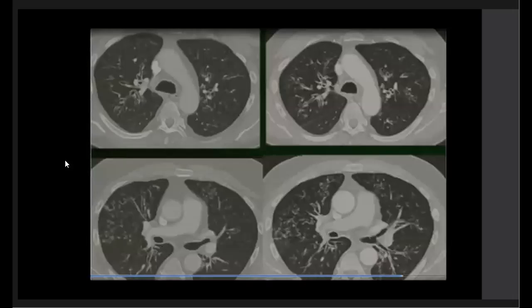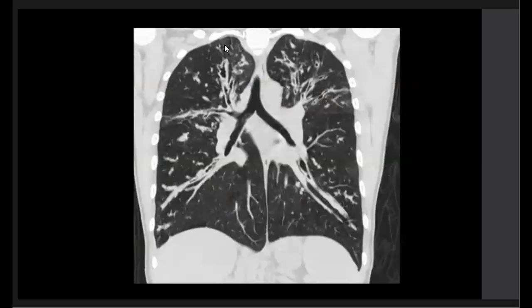Here, a patient with bronchiectasis, and we see a tree-in-bud appearance, as we see here, with some ground glass appearance, and we see some bronchial wall thickening with tram-like appearance, and some signet ring appearance in some areas here. Here, tree-in-bud appearance. Here, tree-in-bud appearance with some ground glass appearance. Here, another patient with bronchiectasis, we see bronchial wall thickening with tram appearance, with regular wall thickening and some ground glass appearance involving most of the upper lobes.